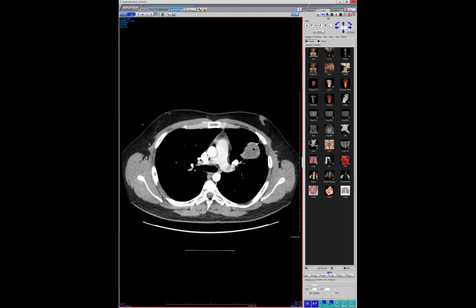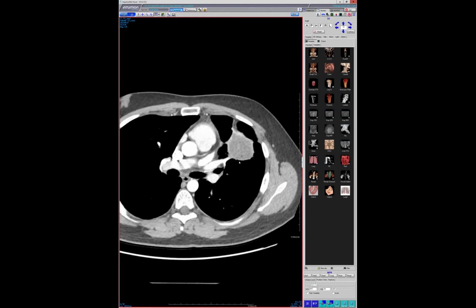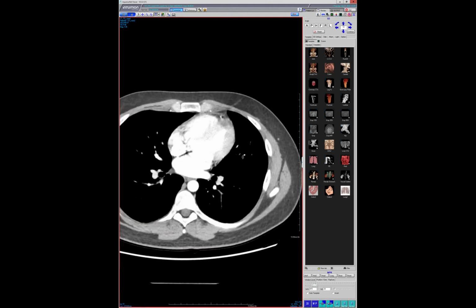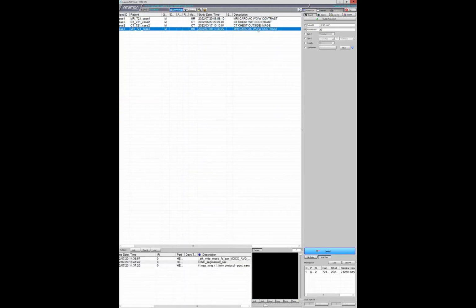But anyways, this was a hydatid cyst. I didn't have many interesting cases today, but here's a treat, and it's treated. When they took it out, they saw the classic lamellar foldings of the cyst, but they didn't find any organisms in it because he had been on treatment for a long time. So that's just a hydatid cyst. I didn't have much interesting this week.